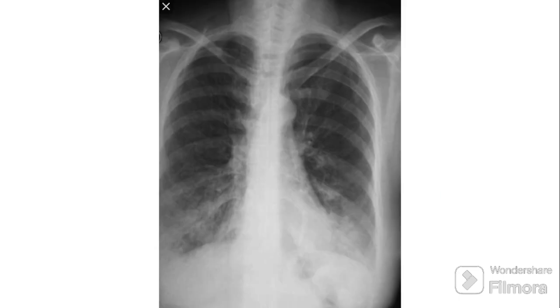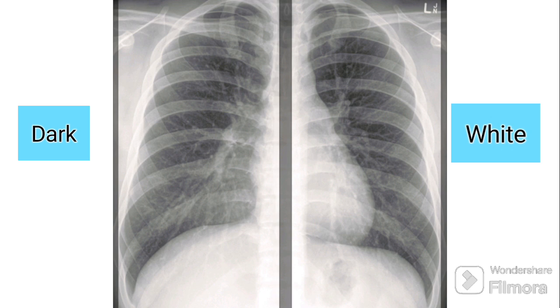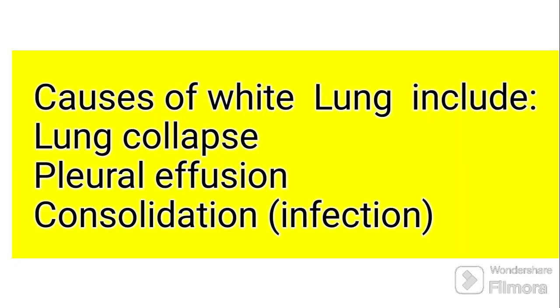Now let's look at the narrow airway. This is an uncommon presentation and usually occurs due to malignancy. Having reviewed the airway, the next step is to look at breathing. You quickly scan all 6 lung zones and consider whether they appear normal or not, white to dark, or have too many lines. Now, let's review the causes of the white lung.